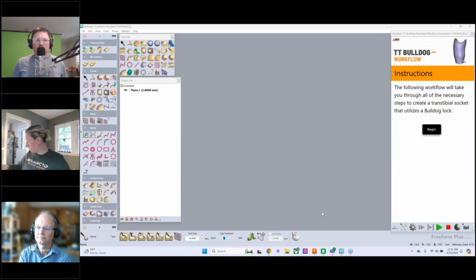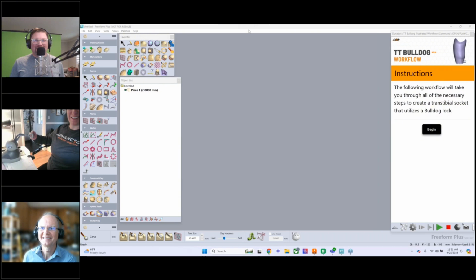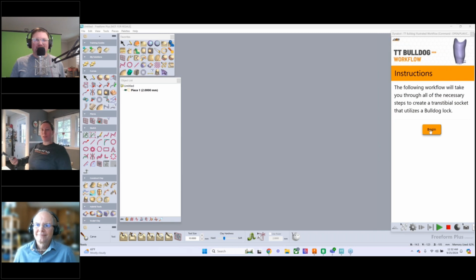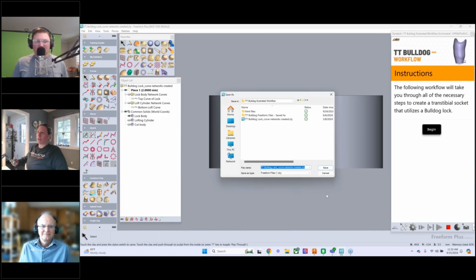So I need my haptic device up. Cool, in case anybody hasn't seen what it is. We'll just click begin and read through this. I'll talk a little bit about what's going on in the background.